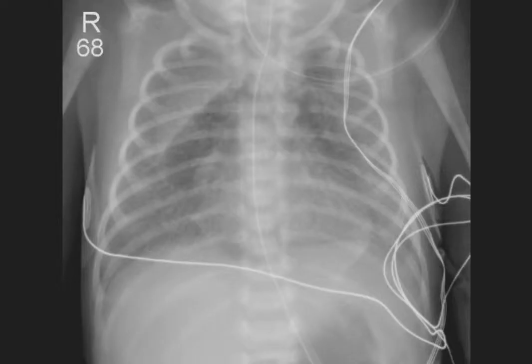And this is that same patient the next day, which sort of proves now he has a very large pneumomediastinum lifting up the right and left lobes of the thymus. The interstitial air may have disappeared, which it often does. Sometimes interstitial air will just disappear completely, or it may decompress as a pneumomediastinum or a pneumothorax, or even worse, examples of which I'll show you later.